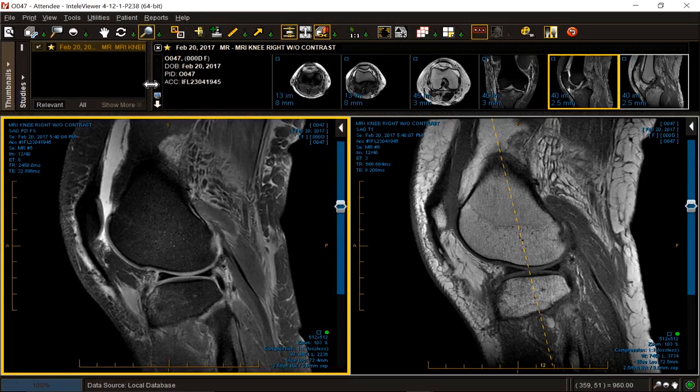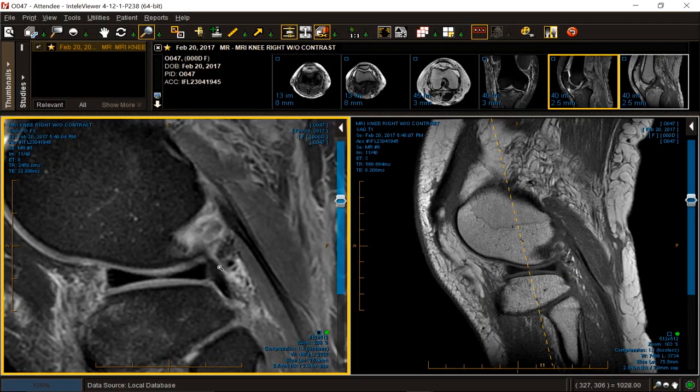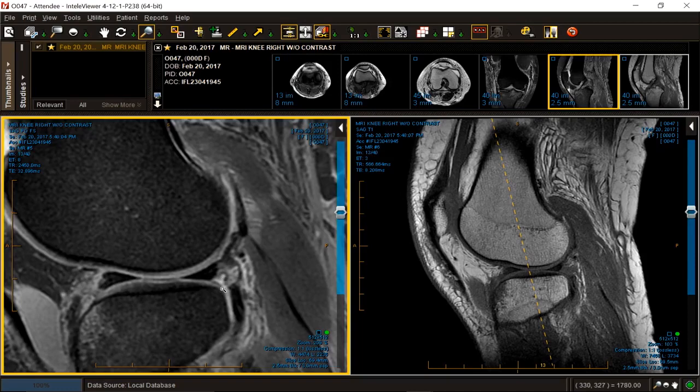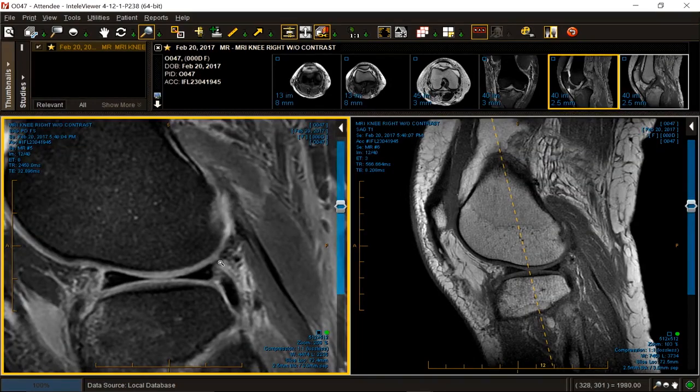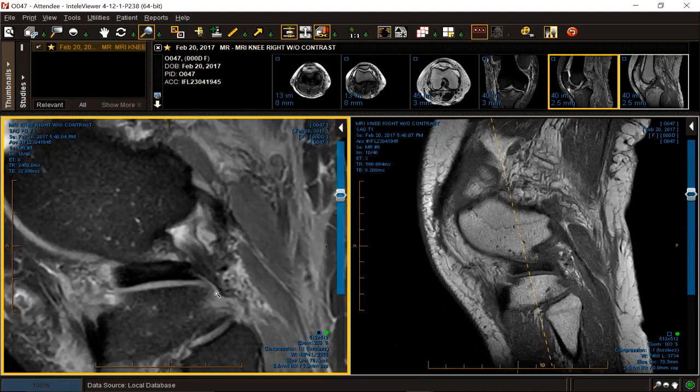However, the popliteomeniscal fascicles are still present. There's a nice tight relationship between the popliteus and the posterolateral meniscus. Maybe that one's a little wavy, a little stretched out, I admit it. The upper one nice and straight. So maybe a sprain on the lower fascicle set. So posterolateral corner injury with a mermaid sign.